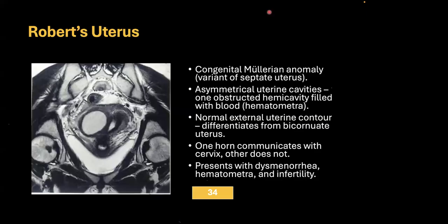Why is it not unicornuate uterus? So how is a unicornuate? We have seen earlier, right? It was banana shaped, with collection and non-communication. So this is actually communicating. It has been obstructed, but it is not completely out. We could have given it one differential we can consider. I guess we can consider it as unicornuate as well, but it came out as a septate variant.